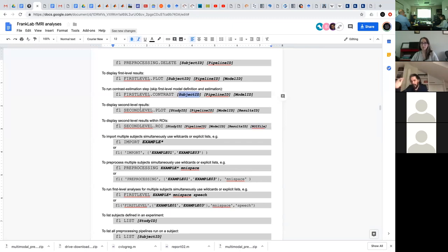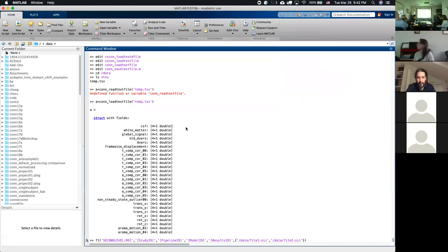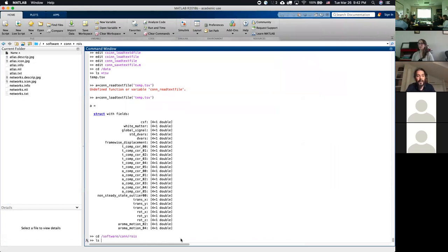Typically when you have consecutive numbers, you have two files. For example, let me show you here. It would be really easy if you could upload just a CTAB with all the ROIs and save that. And yes, it works. This actually accepts FreeSurfer annotation files.